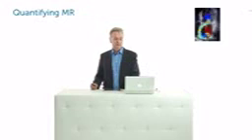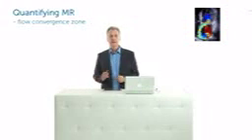But how do we quantify regurgitation then if we have eccentric jets? By the so-called flow convergence zone. We talked about that zone already. Let me show you once more. This is a still frame of an eccentric jet. What we should look at is exactly this region here. You see that there all of a sudden is a change in color from blue to orange, which means that we have an increased velocity right at this outer shell.